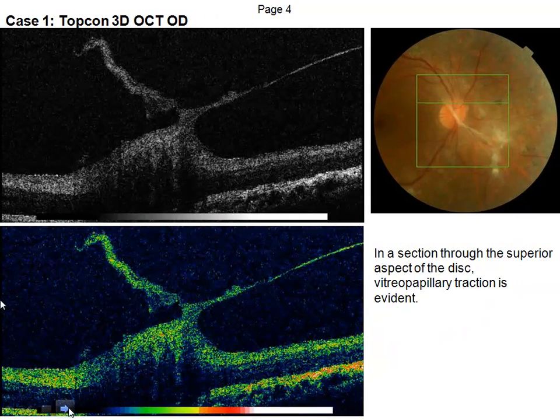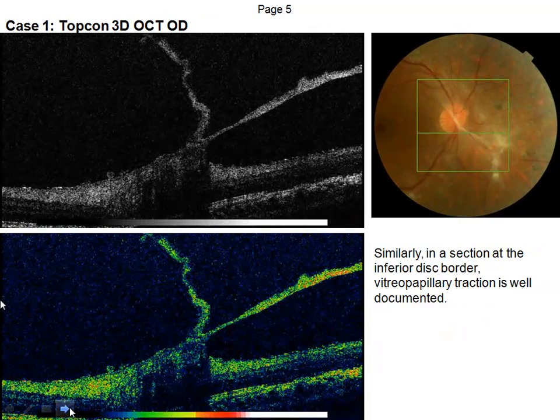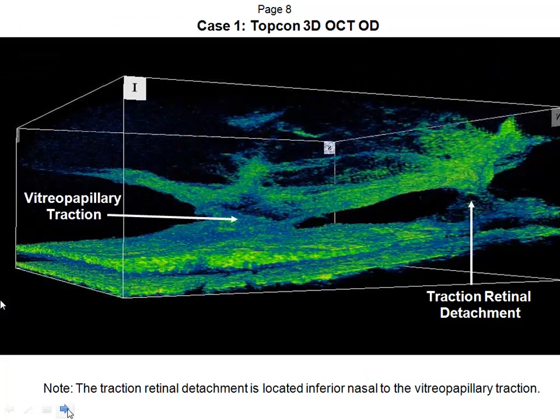We'll do this quickly. And we can see this patient had neovascularization of the disc. And what we're seeing here is now a traction retinal detachment. This is the vitreous tugging on the disc. And you'll see down here that the retina is actually detached in certain spots. This is actually a fairly common finding in advanced diabetics. Traction retinal detachment shown right over there.